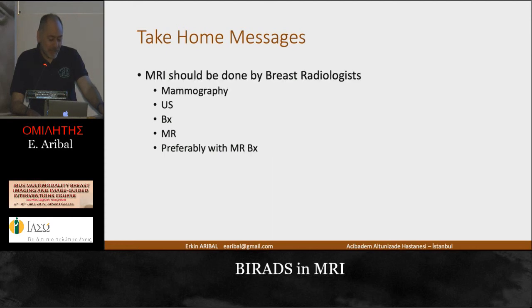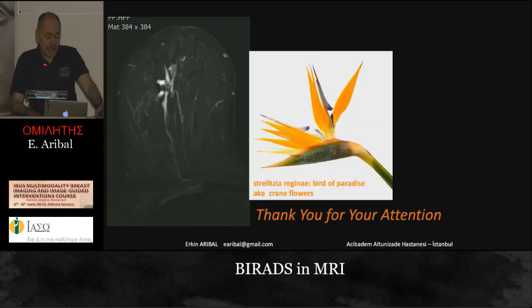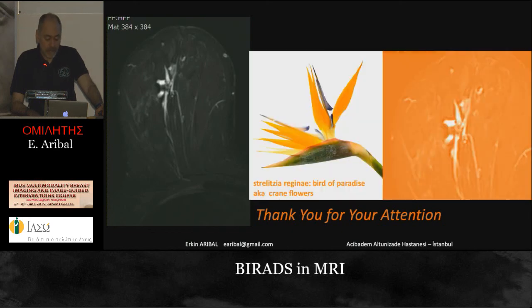MRI should be done by a breast radiologist, and you should always compare your examination with the mammogram and ultrasound and do the biopsy. And you should be able to do them all, to report them all, and to evaluate them all. And preferably, you must have an MRI guided biopsy option. So thank you very much for your attention. This is a ductal contrast enhancement, which looks like this flower when I change it to orange. Thank you very much.